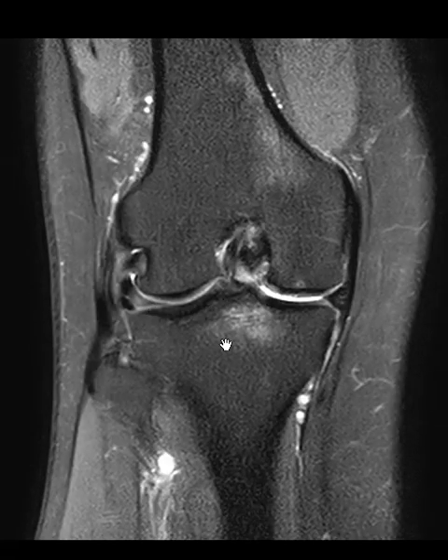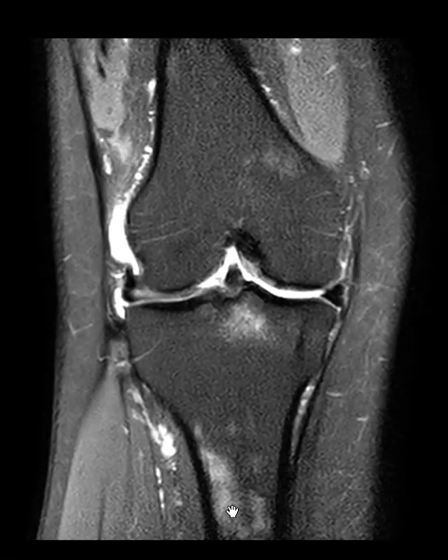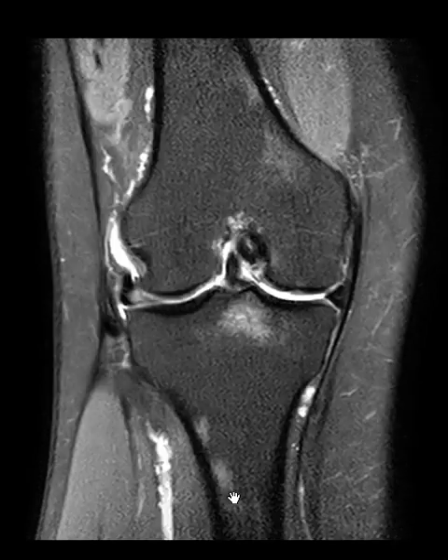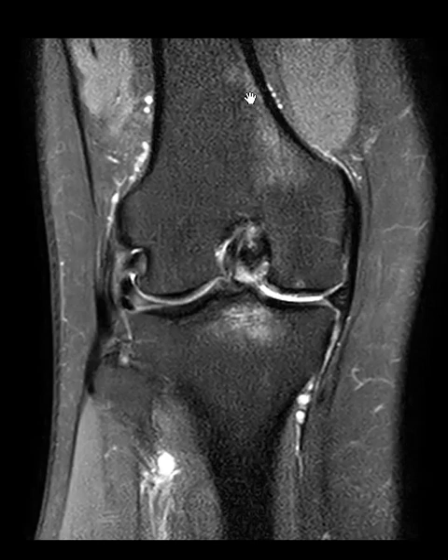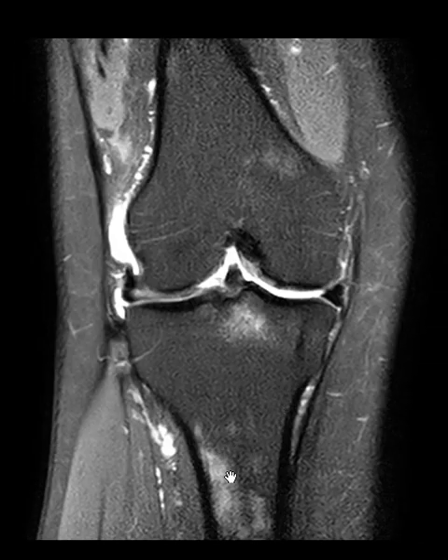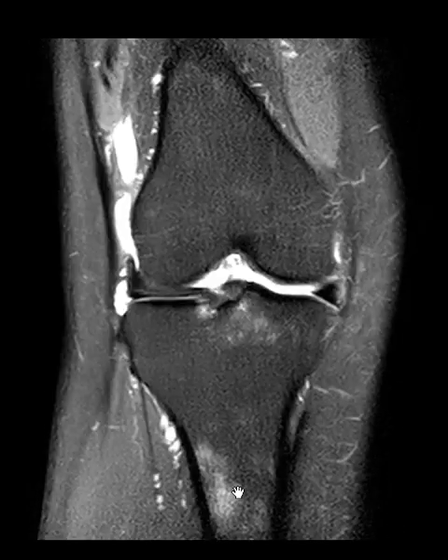So we know why he's having his knee pain, but he also has some patchy abnormal signal down here in this tibial shaft, or tibial diaphysis. A little bit up here, this is clearly physiologic. It's very hazy and uniform, does not look pathologic at all. But down here, this is more splotchy and it's more hyperintense, so this is a little bit more worrisome.